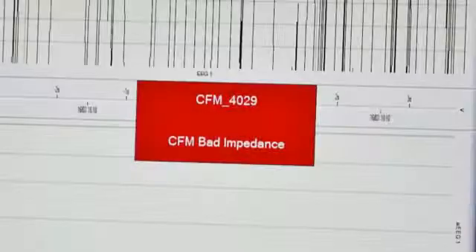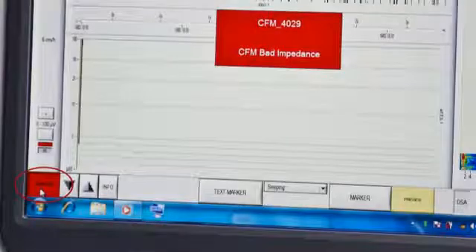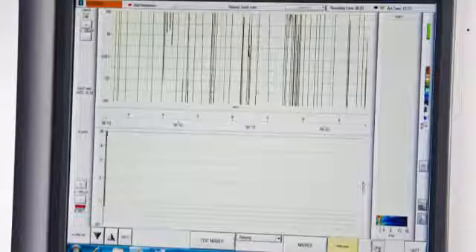If the impedance or amplitude threshold is breached, then there will be a visible and audible alarm. The thresholds of these can be set in the setup menu. To silence the alarm, you click the Alarm On/Off button in the bottom left-hand corner. Once the problem is rectified and the AEEG or impedance falls below the alarm threshold, then the alarm will stop.